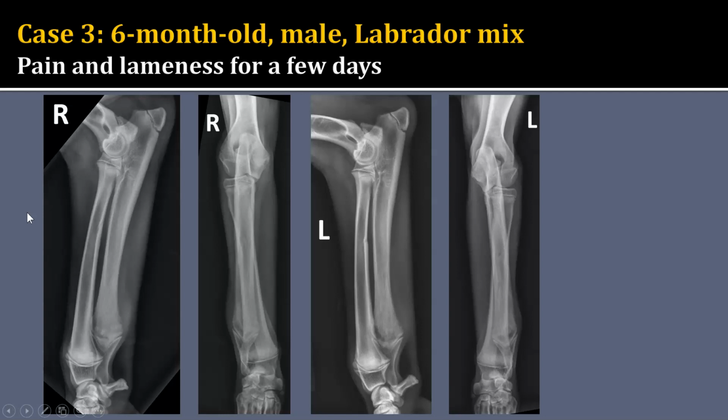So in this patient, alignment looks good. And then I again look for soft tissues. And when I look down by this distal ulna, I do see this kind of focal soft tissue swelling that's extracapsular on the right side, kind of centered around the distal ulnar metaphysis. And when I look at the left side, I also see similar soft tissue swelling that is extracapsular centered at the distal ulnar metaphysis. The other soft tissues are fairly normal.